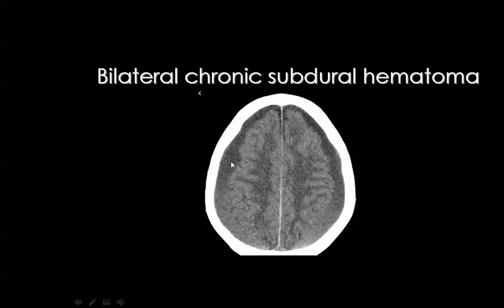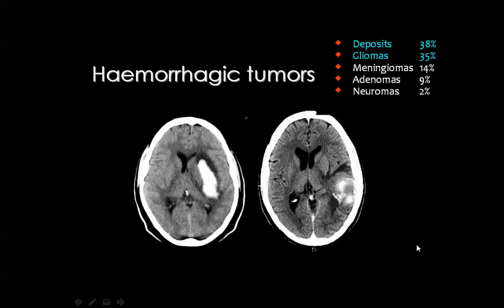Usually, it may be larger on one side compared to the opposite side. And frequently, these types of hematomas are presented in the exam because many of the candidates will look at the sizable hematoma and forget to look at the smaller one on the opposite side.